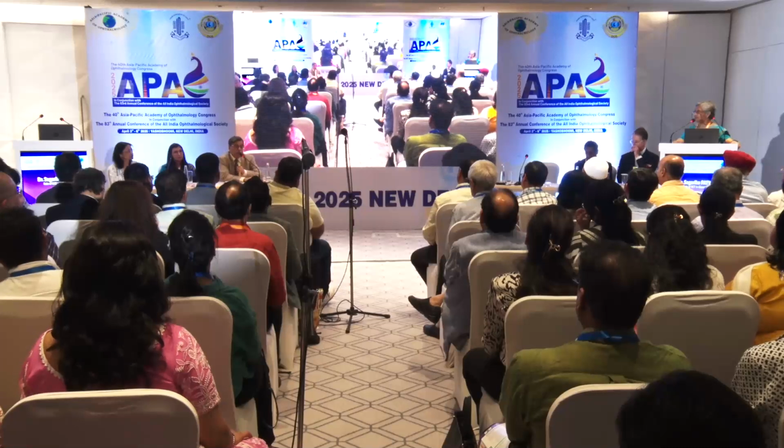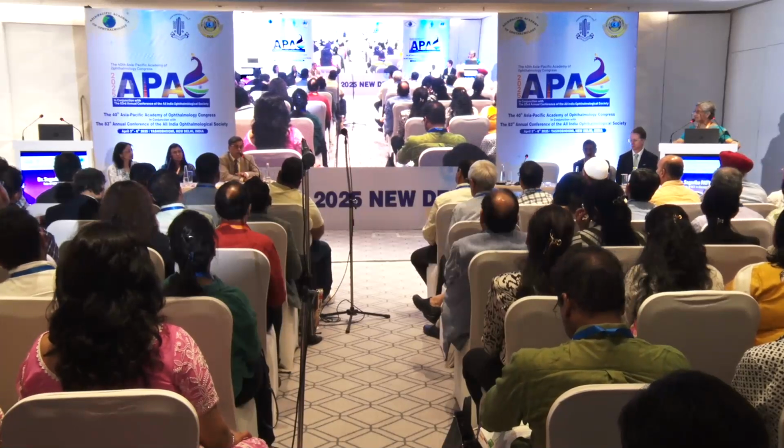I think one thing should be clear. While we stress on OCT with retina, remember, retinal disease will destroy the macula and the central field. Glaucoma will destroy the peripheral field, and you may miss glaucoma in the presence of a retinal disease. So I consider it equally important that when I'm evaluating a patient for macula, I also make sure I don't miss the glaucoma. And the OCT for RNFL is an important part of my workup for retinal disease also.